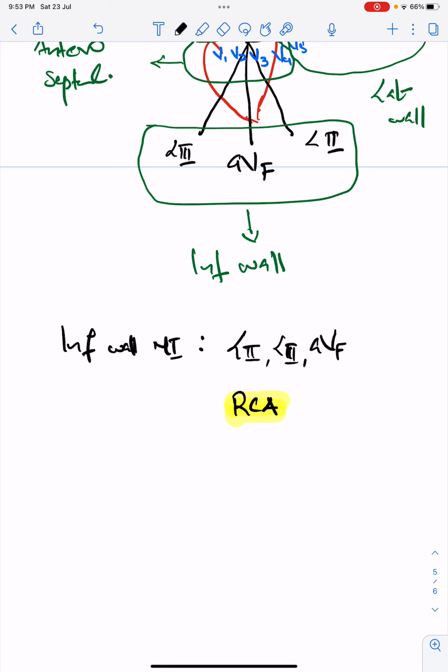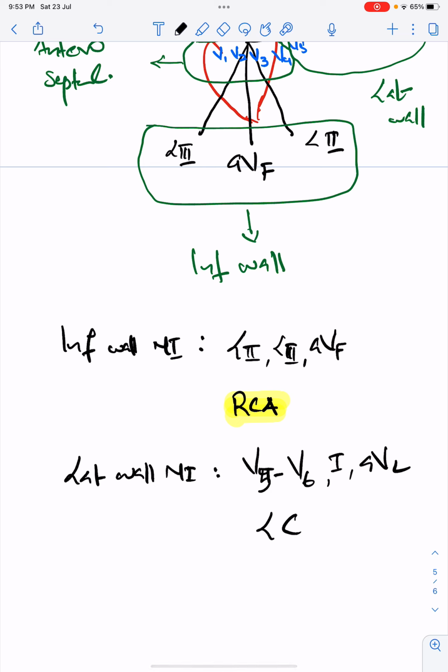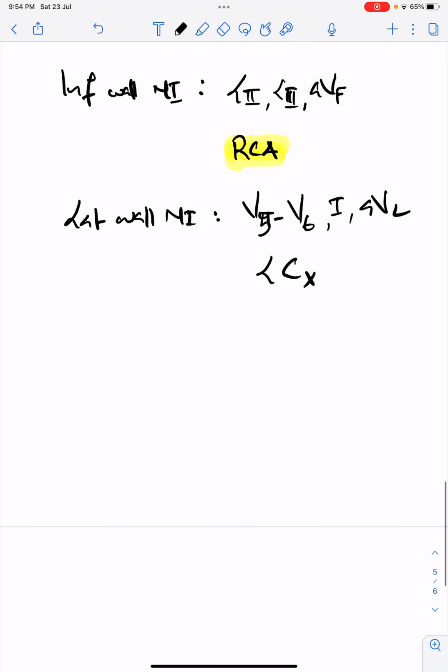In the case of a lateral wall MI, the leads involved are V5, V6, 1 and AVL. The culprit artery will be the left circumflex artery. Okay, left circumflex artery.